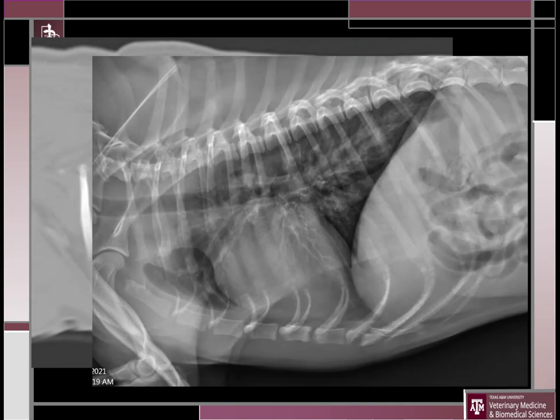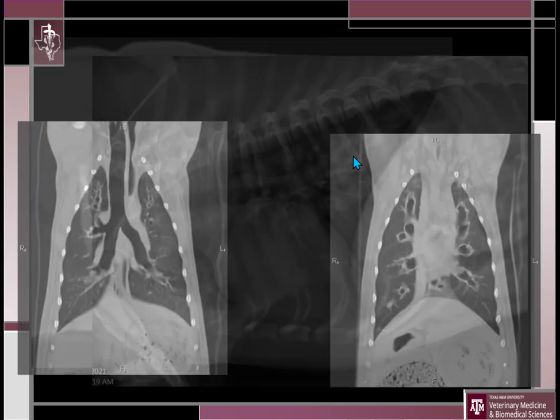And this is the thoracic radiograph on that same animal. It was very easy to illustrate and see these changes on the CT, and much more difficult to identify on the radiograph. But you can still see that there's thickening of these airway walls. Here's an end on one. So see how there's soft tissue. There's a donut right here. And we have these thickened soft tissue walls of the bronchi going through. So I see more lines. If I look at this, I just see more soft tissue, linear type structures.